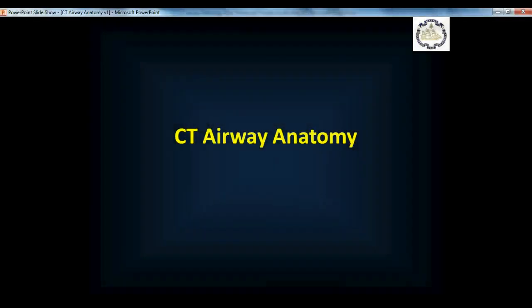Now I'd like to take you for a guided tour of the airway. I find the best way to do this is to look at it in an anatomical relationship perspective. The CAT scan is an amazing tool that gives us a three-dimensional image of human structures, and they show us the relationships between structures that we might not otherwise see in diagrams without looking at them in real human beings. So we're going to walk through CAT scan images.